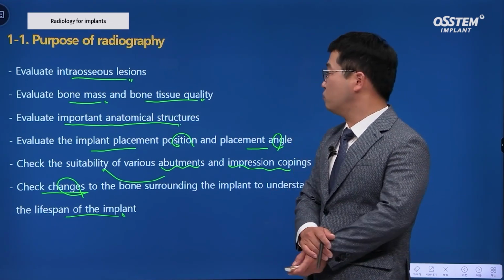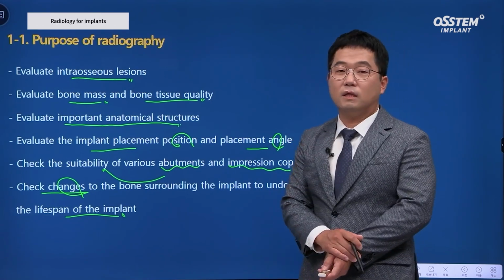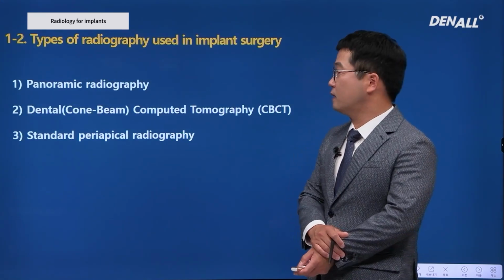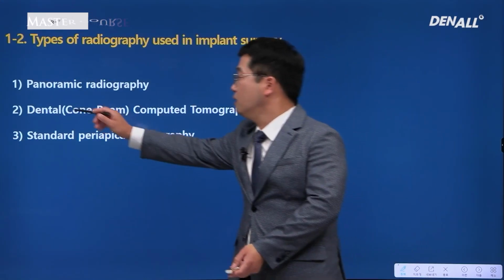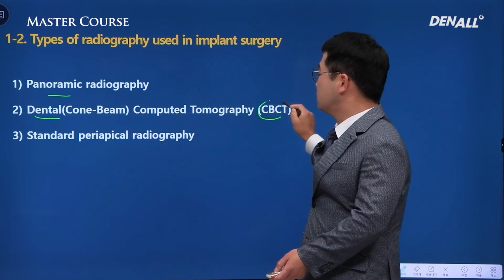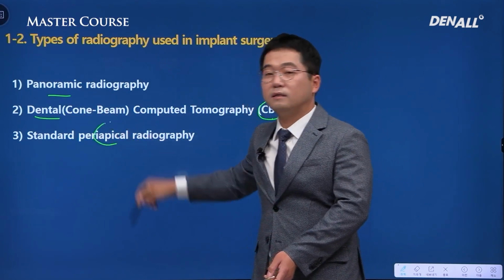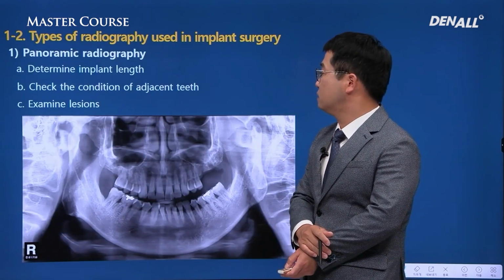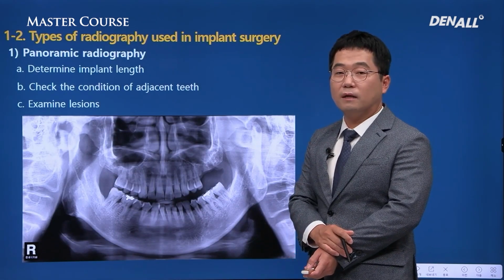There are additional factors, but this is what we're going to address. As mentioned, panoramic image, CT, and periapical image. The three are used primarily for treatment. First, let's look at panoramic images.